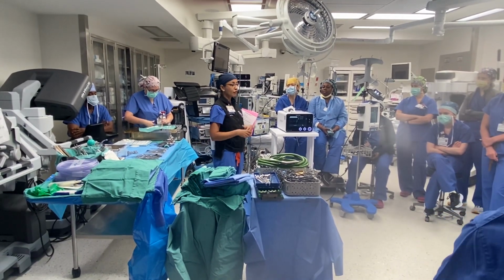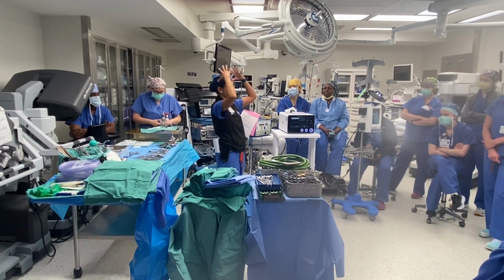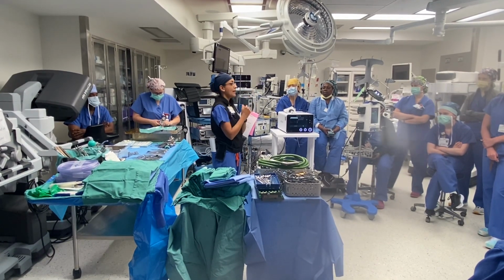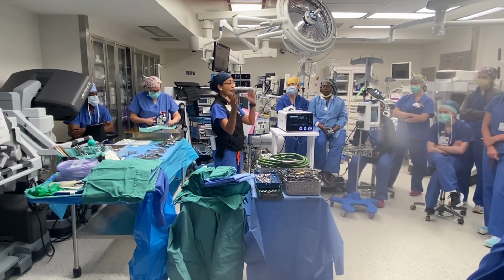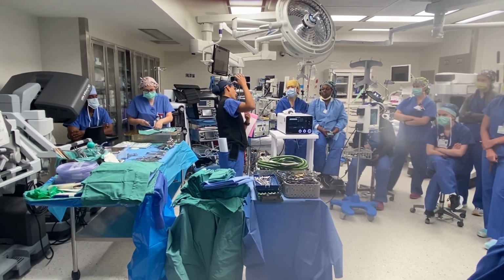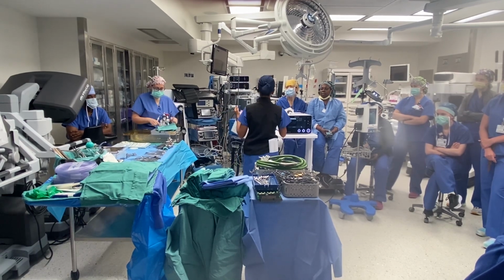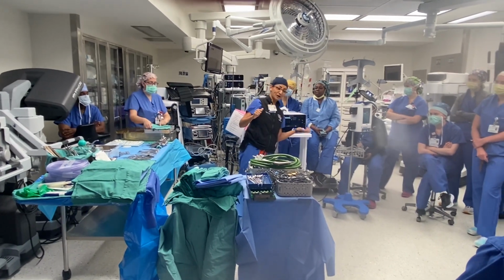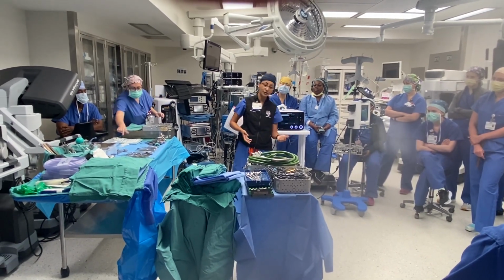We think about the brain as supratentorial and infratentorial: top of the head and back of the head. For the top of the head, which is most of these cases, it's right or left, and that's going to be the side that we want up. So in a right-sided crani, we're going to be like this on the bed. The patient's going to be supine with the head turned like that.